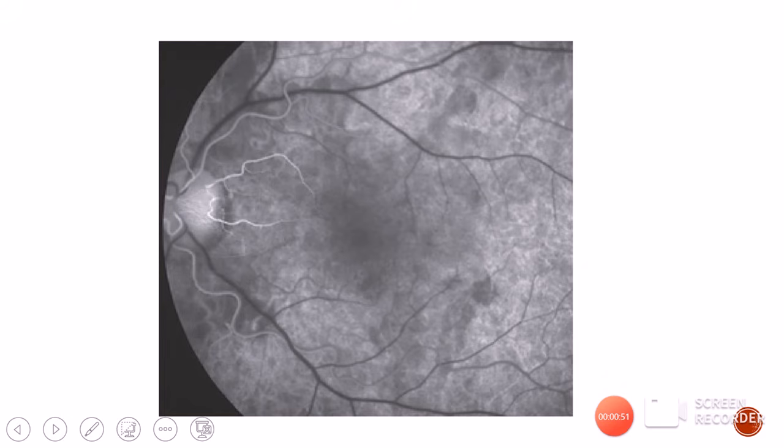Now this picture over here actually depicts the arterial phase. You can see that there is a background fluorescence which is coming from the choroid, and then you can see the veins are still darker in color because they are not filled. However, the arteries have started to get filled up. So this is the one artery which you can see is looking whitish in color, and over here also the peripapillary arteries have started to get filled up, and this is called the arterial phase, which occurs about 1 second after the choroidal phase.